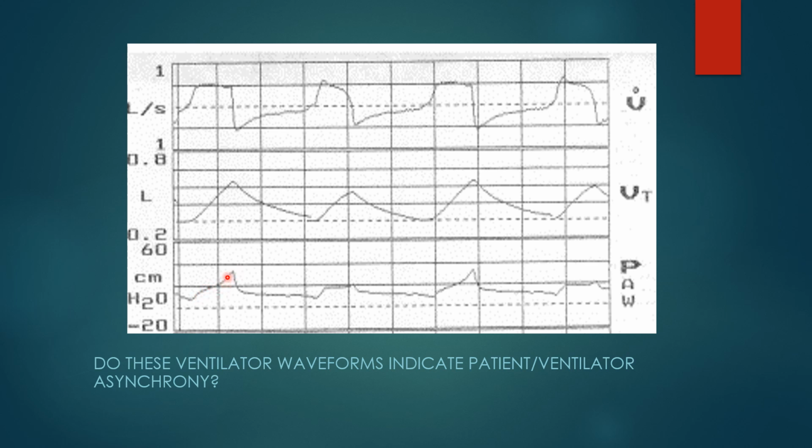And so that is a patient who is not synchronous with the ventilator, because the ventilator has a set I time that is not the same as the patient's neural I time. Now, we see the same problem here on the pressure-supported breath. You remember, it's fine details. There's a little bump right there at the end of inspiration, and that's the patient trying to stop inspiration from that pressure-supported breath.